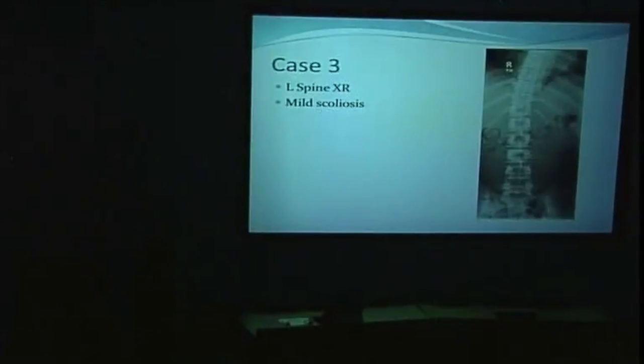Here's his lumbar spine now. Not quite right, is it? Anybody spot any abnormalities there? Poor projection, I agree with. Definitely there's a scoliosis. And a muscle bulge, did you say?